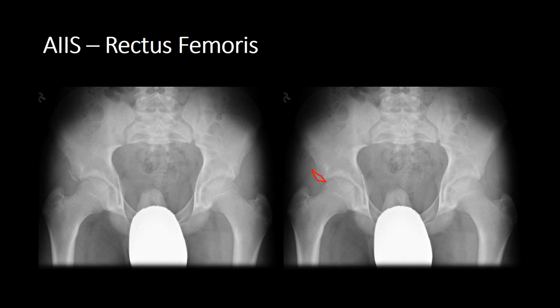So this is the second most common avulsion fracture. And again, when we look around the outer cortex of the pelvis, this is where we'll be able to identify this avulsion fracture. And again, if you compare the opposing side, we can see that you've got a piece of bone detached with a clear lucent line between the avulsed bone and the host bone, whereas in comparison on the left you've got a nice smooth cortex and no evidence of an avulsion at all.